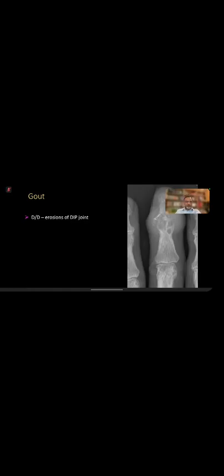So we have ruled out rheumatoid arthritis. What else can you consider in the differential now? Gout is one. Sarcoid, yes. Septic possibility with the bone density like that. Let's stay on the things we mentioned before. Let's stay on the common things. Psoriasis, very good.